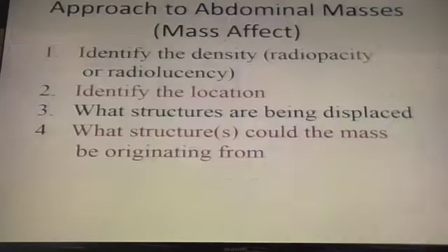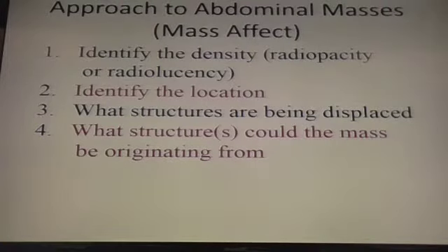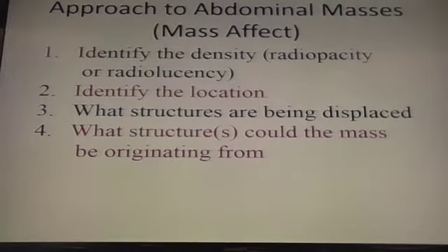Go back to the one. What is that? I'm sorry. No, this would be, now we're talking intra-abdominal.